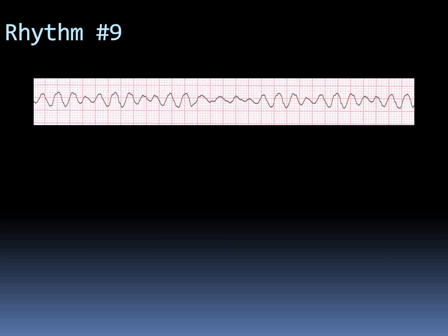All right, so Fatima said it's ventricular fibrillation, and she's very correct, because in actuality you just see the baseline waving up and down, up and down, and see how irregular the QRS morphology is. This QRS is extremely wide. This QRS is even more wide, and this QRS is pointed. So there is no uniformity in the QRSs. They are very wide, they are irregular, and the patient is highly symptomatic. So this is an ECG of ventricular fibrillation.